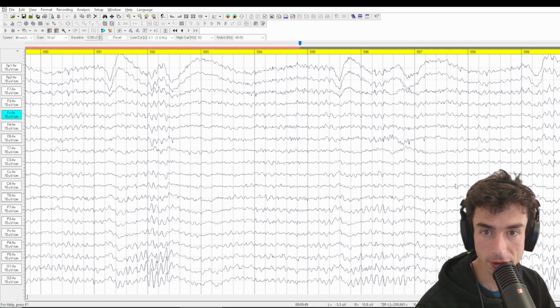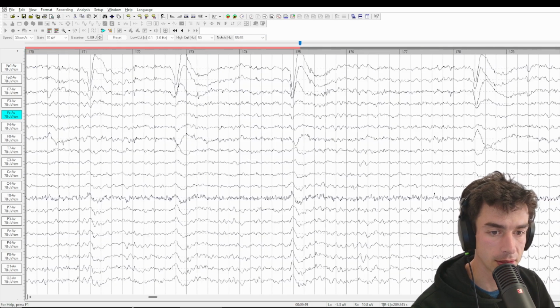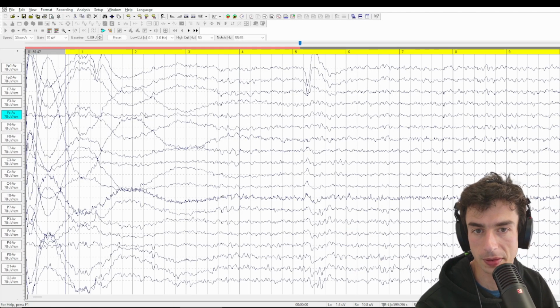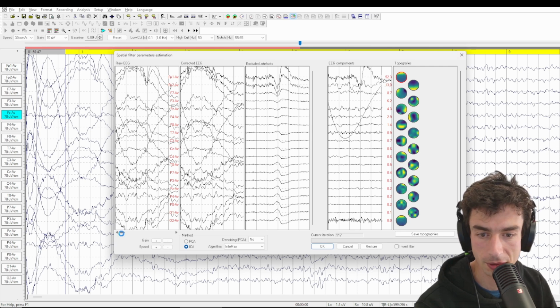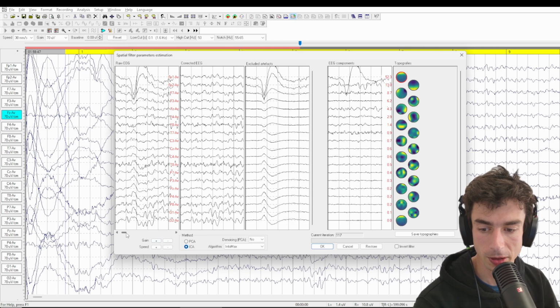Great 10-minute recording. And let's conduct the ICA artifact removal. I'm going to left click at the beginning of the record, click on Mark Artifact, and turn off the PCA denoising because we have a nice fast single thread computer here. And the first component often will be the eye blink component.